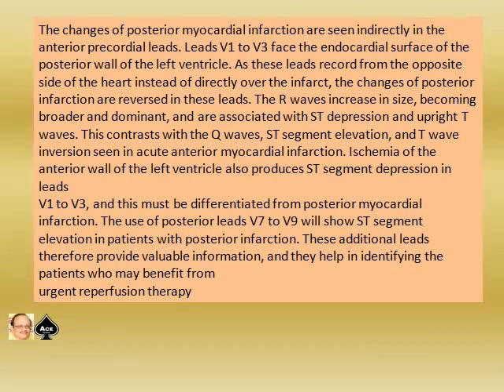Acute anterior myocardial infarction. Ischemia of the anterior wall of the left ventricle also produces ST segment depression in leads V1 to V3, and this must be differentiated from posterior myocardial infarction.